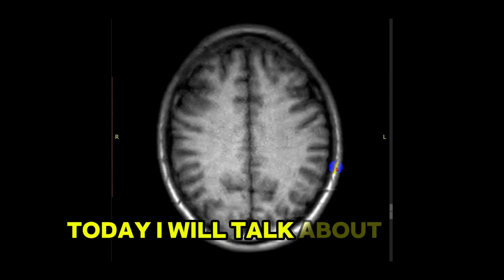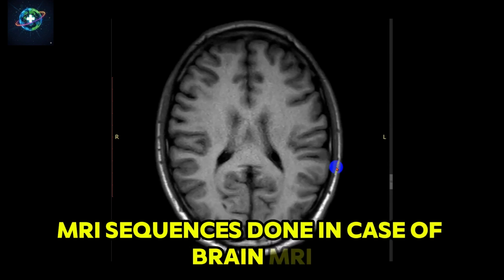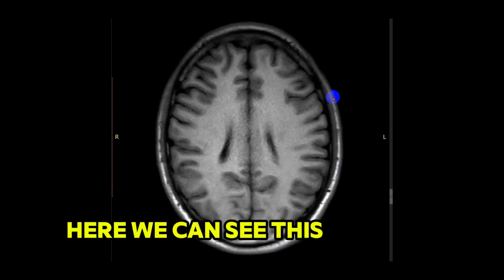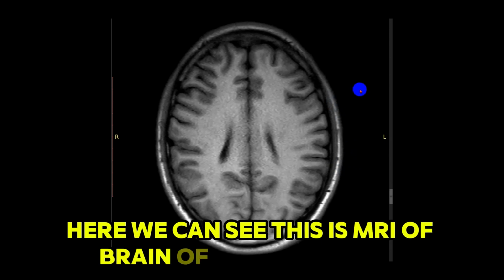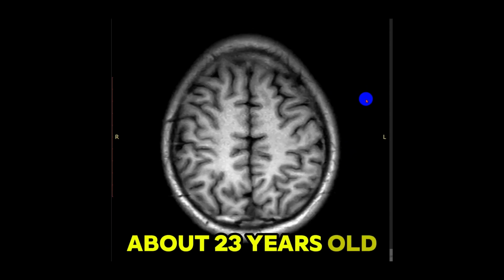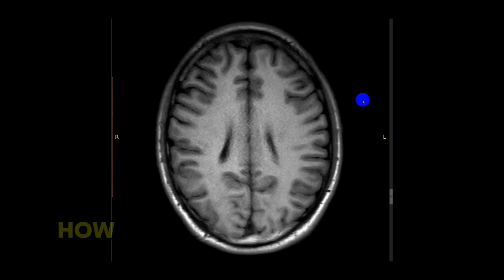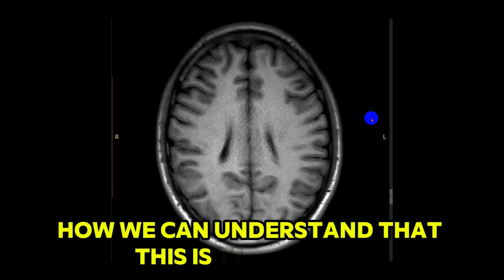Today I will talk about the basic MRI sequences done in case of brain MRI. Here we can see this is an MRI of the brain of a male patient about 23 years old. This is the T1-weighted image. How can we understand that this is T1-weighted?